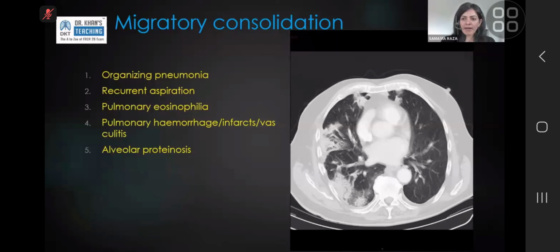No, we're implying a pattern in the last few months where the patient presents with a bilateral looking consolidatory pattern, but it got better or resolved or improved and came back a few months later, still bilateral, but in different places. Or some of those previous patches got better, new ones came in another place, and some are getting bigger, some are getting smaller. This is called fluctuating consolidation or migratory consolidation. It's not the same consolidation moving from place to place. It's different time frames of different areas.